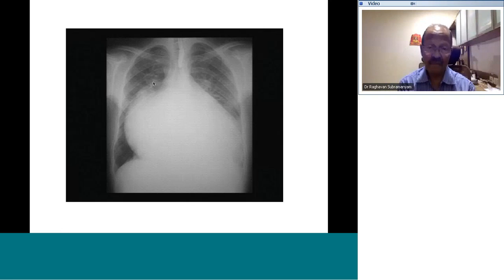One thing I'm sure of is that this is not pericardial effusion. There could be pericardial effusion, but this is not primarily pericardial effusion. The cardiac contours are still preserved. You can see the SVC here, and I can see clearly the angle between the SVC and the RA. I can see little changes in the configuration in the left cardiac border. This is not the appearance of pericardial effusion.